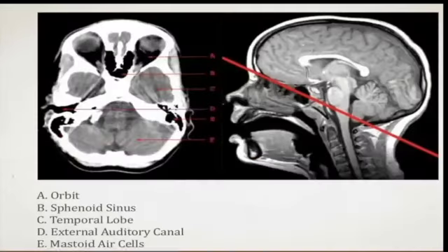Okay, so let's get to the real stuff. Let's get to the CT images. Now I know this is what you came for, so let's start delving into the images. Now, we need to look at CT brain images from the most inferior going up. As I told you previously, if you work as a radiologist, you will be scrolling up on your mouse, and that will be moving the image from the most inferior to the most superior. So you go inferior going up.